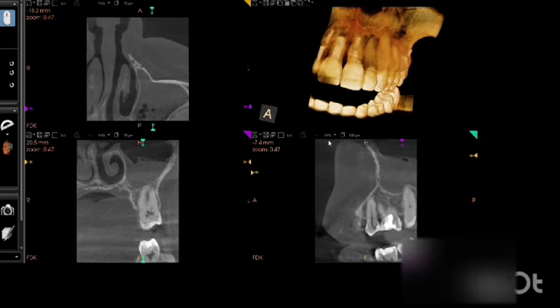And the typical radiographic difference between the two is that in acute sinusitis, either the complete sinus can be filled with fluid, or just the air fluid level can be seen, but the walls will remain thin and intact. But in case of chronic sinusitis, the walls will be very thickened. Why? Because of the pressure exerted by the gas and the inflammation happening over a long duration, which is responsible for the thickening of the walls in chronic sinusitis.